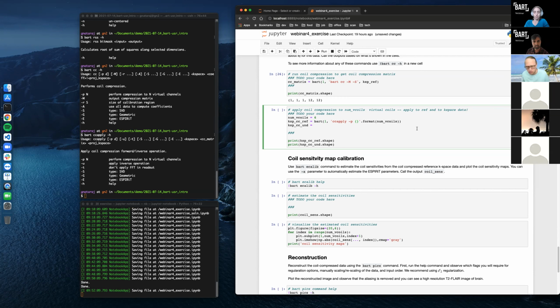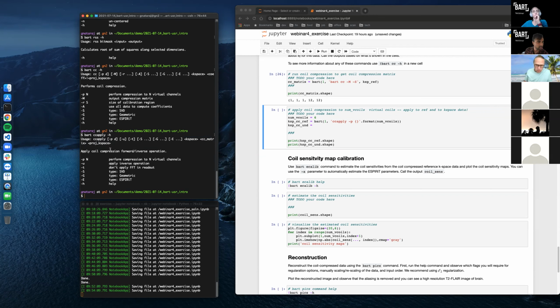So it looks like it needs three inputs that it always needs: K-space, CC matrix, and projection K-space. The convention to read this is that the last object is typically the output, and the remainder are inputs. I realize it's a little confusing. So actually, there's two inputs and one output.